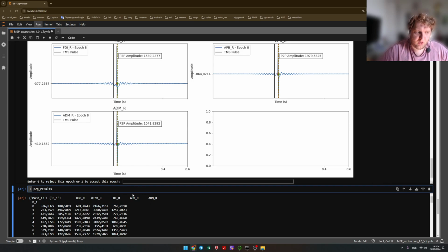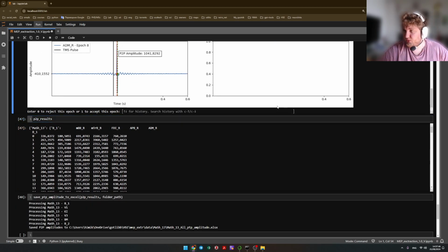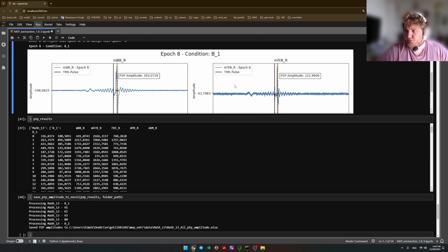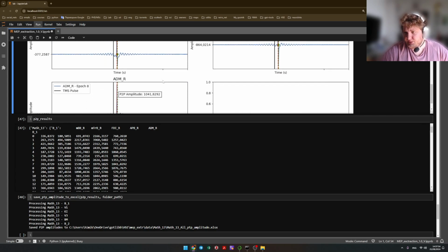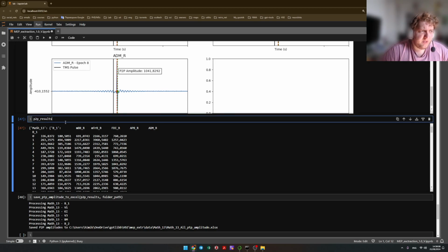So, for example, you did all this process because this is iteration through all conditions, through all the epochs, and obviously through all the muscles. It also could iterate through the participants if we put every participant in the same folder, like raw files, as I said.